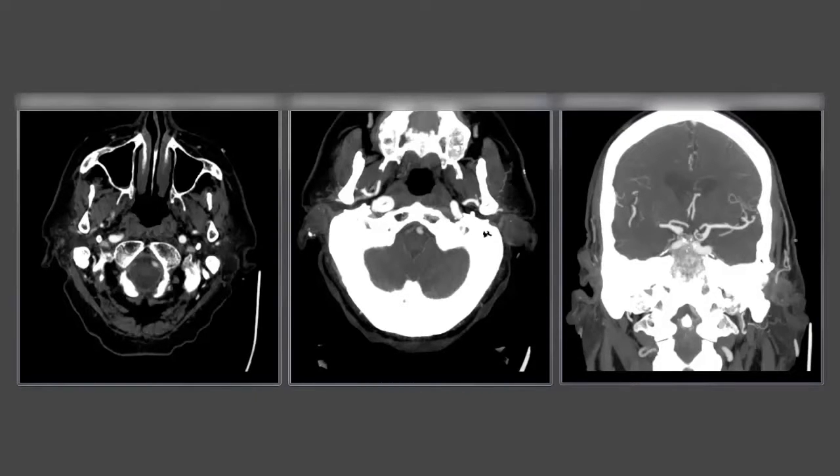We're going to talk in this video about basilar artery occlusion as a cause of acute stroke and how to identify basilar occlusion on a CT angiogram. So this patient presented with a severe stroke syndrome, including profound alteration of mental status, progression into stupor and coma, as well as quadriparesis, weakness of both arms and both legs, profound abnormalities of extraocular movement, and an impaired pupillary light reflex on both sides. That's a classic description of a severe basilar artery occlusion, ischemic stroke.